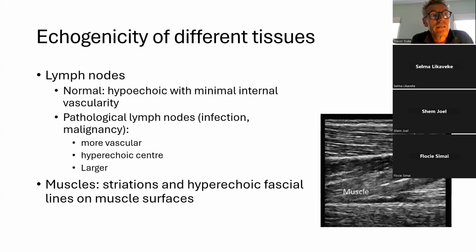Muscle, for example, muscle is connective tissue, and so you'll see all these striations, these hyperechoic striations within it. So that when you look at that ultrasound I've shown in the picture, it looks more like muscle, doesn't it? You can see that's muscle.